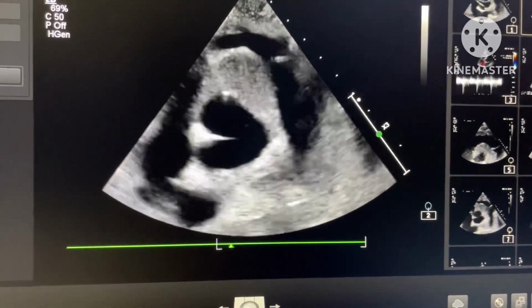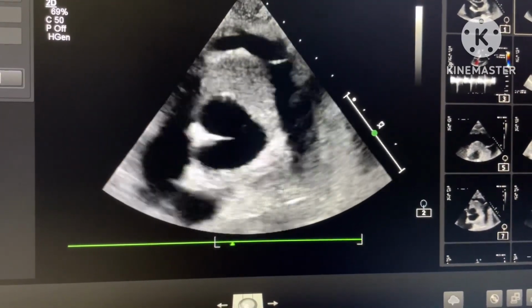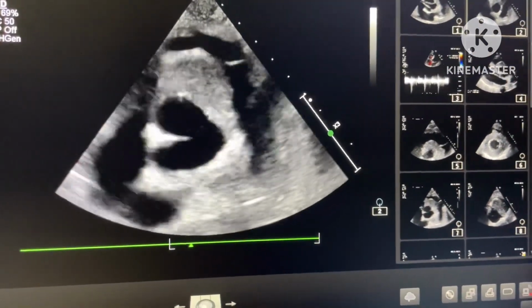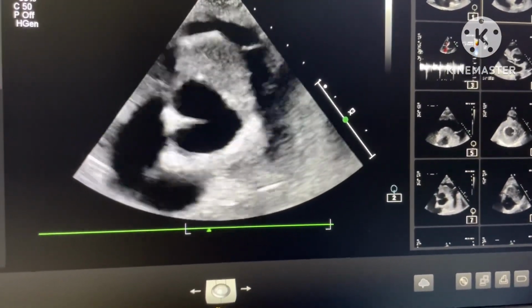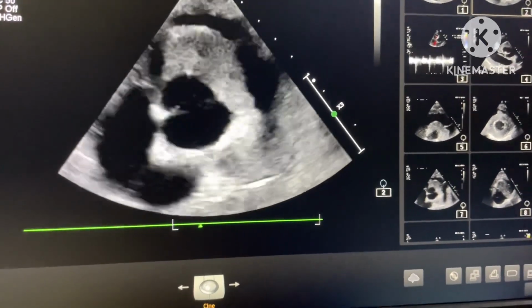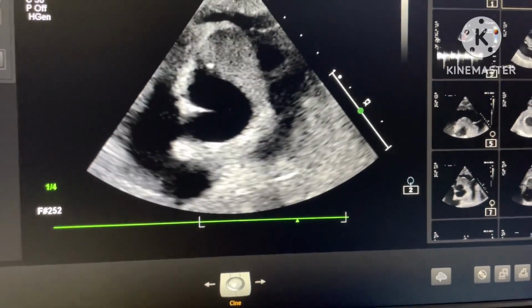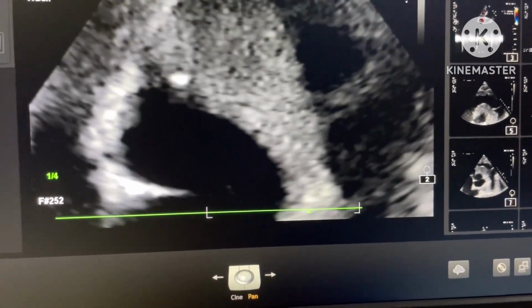I want to trim the image a little bit so that you get the real image, and make the image a little bit slow. At the same time, I zoom the image so you get the correct point.